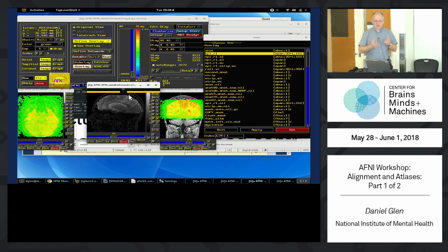Yes, so everything goes to just underlay when you use these 4, 5, 6 keys, because it's a little bit confusing to add colors on top of this. It's made to just merge 2 images without color, because they're supposed to be similar in some way. So this is with both the 6 and the E. That is allowable there.